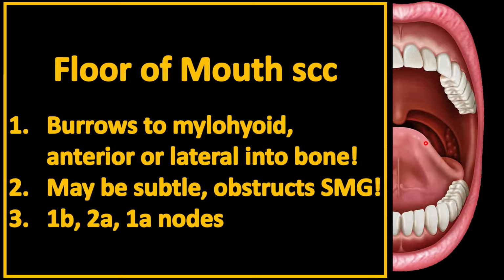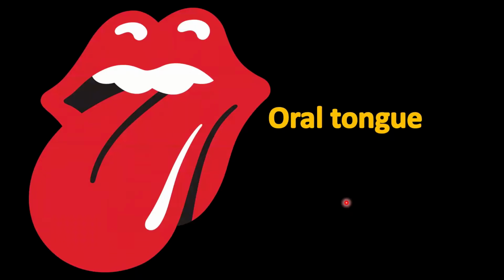You need to have bone algorithm windows. They can be subtle, small tumors in the anterior floor of mouth that are really difficult to see on CT. But if you see an obstructed submandibular gland, yes, absolutely look for calculus, but also be suspicious that there is a tumor there. Now, fortunately, these are pretty easy for most clinicians to see.